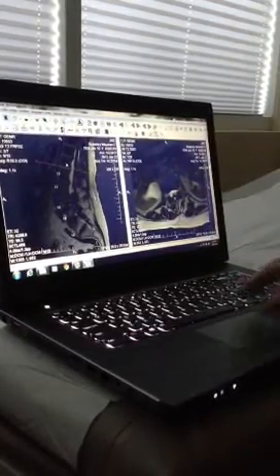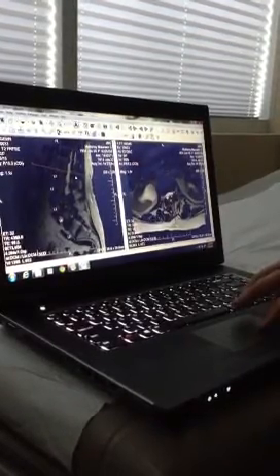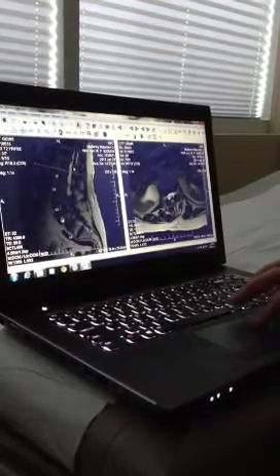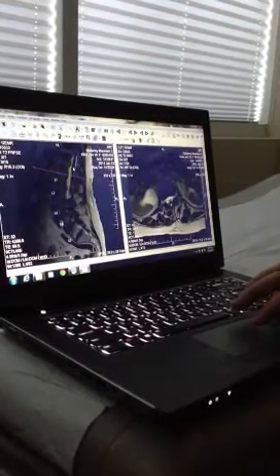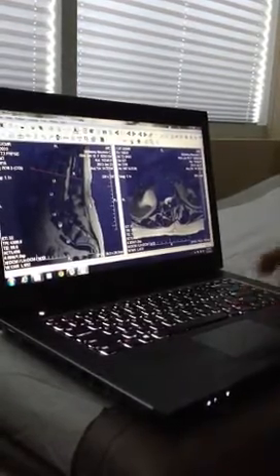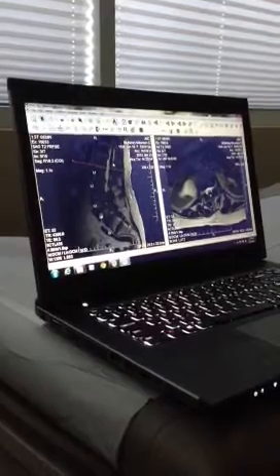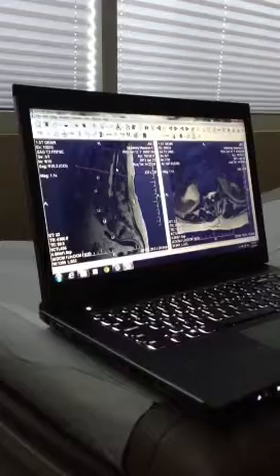So, what do we see here? Well, first of all, we're still at the level of the spinal cord. So where's the spinal cord on the left? The spinal cord on the left is this gray structure right here, okay? The spinal cord is bathed with this white fluid in the front of and in the back of the spinal cord. That is called cerebrospinal fluid. Cerebrospinal fluid has glucose, protein, and water, and it functions to cushion the spinal cord and the nerves.